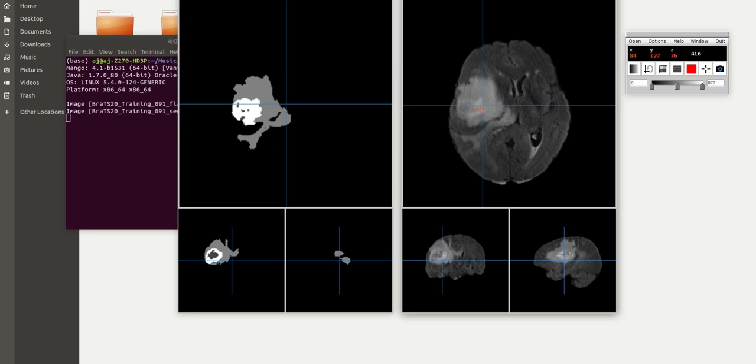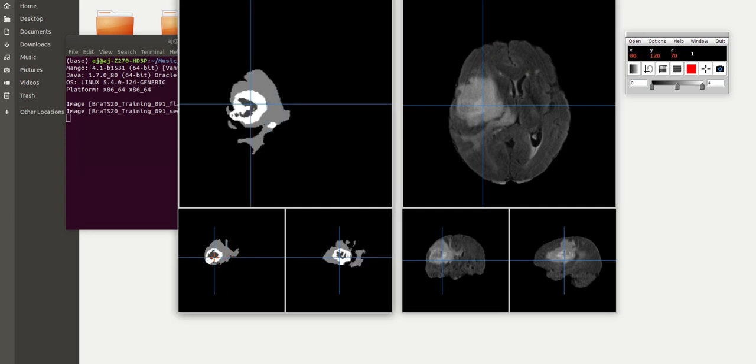I hope you are able to see the tumor here. This is what the original tumor looks like, and this is the segmented tumor. Each tumor consists of many portions. A brain tumor consists of the tumor core, this is the tumor core, this is the enhanced tumor, this is the whole tumor, and this is the background. So during segmentation you are required to classify 4 classes along with the location of the tumor.